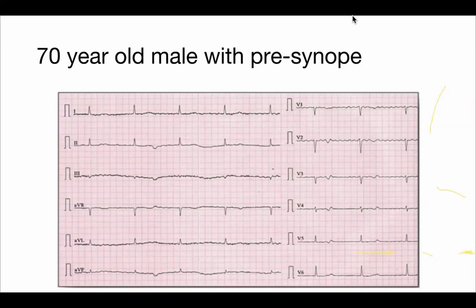So in any atrial flutter ECG, usually there will be one flutter wave for one large square. But here, if you look at V1 and V2, in 3 large squares there are about 4 waves. This is physiologically incompatible, right? Flutter means a macro circuit.